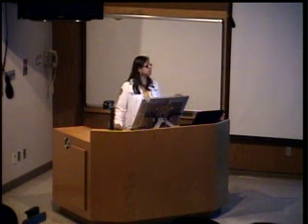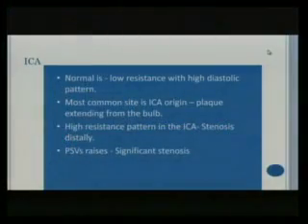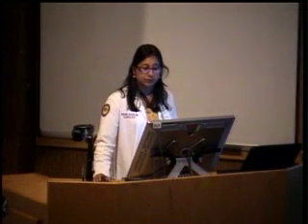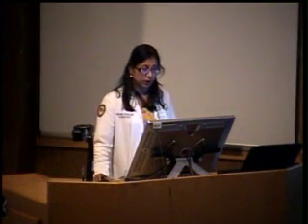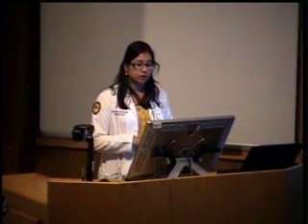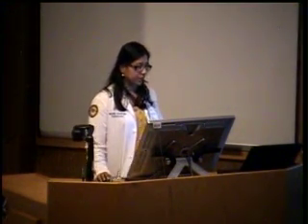So this is the third lecture we're taking on the carotid artery Doppler. We've already done Doppler artifacts, and in my last conference, we just talked about the common carotid artery, and we spoke about the normal waveforms, how to optimize the image, how to know some technical factors, and also to see the abnormalities with focal or diffuse disease of the common carotid. Now I'm going to be talking about the internal carotid, the external carotid, the vertebral arteries, and a few cardiac anomalies that can cause aberrant waveform patterns.